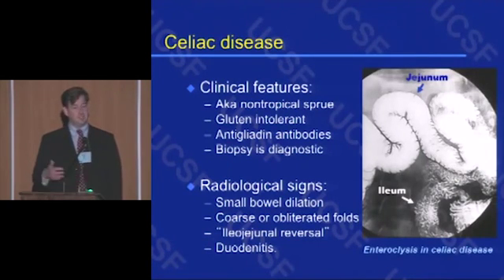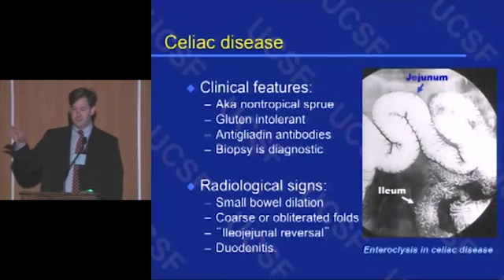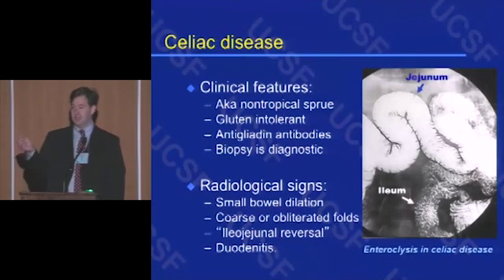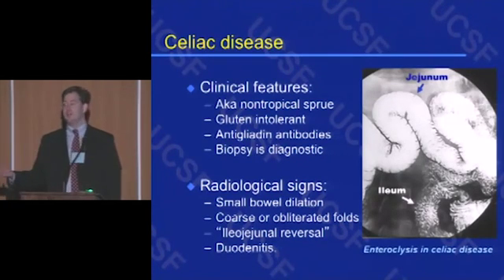Sometimes they come in with a CT scan that's negative. They get an upper GI examination for further evaluation. And what do we see? We see these diffusely dilated, fluid-filled small bowel loops. You get the classic reversal of folds. The ileum looks like the jejunum, the jejunum looks like ileum, and people like to describe that the duodenum looks like hell. What it is, you get this duodenitis, this massive inflammation of the duodenum, and that's how they make the diagnosis. That's the diagnostic hallmark.